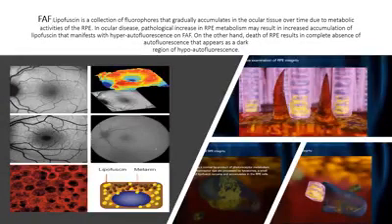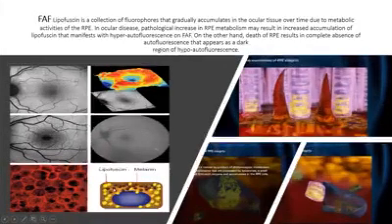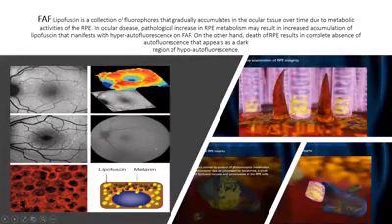The other imaging modality, which is very interesting, non-invasive and very informative, is the fundus autofluorescence. Just to give a short detail about this image, the fundus autofluorescence is an imaging modality which depends on the lipofuscin, which is found in the retinal pigment epithelium, and it is a byproduct from the digestion of the outer segments of the photoreceptors by the retinal pigment epithelium.